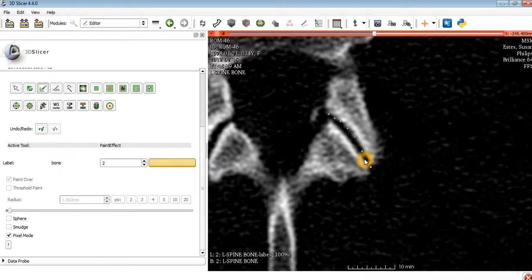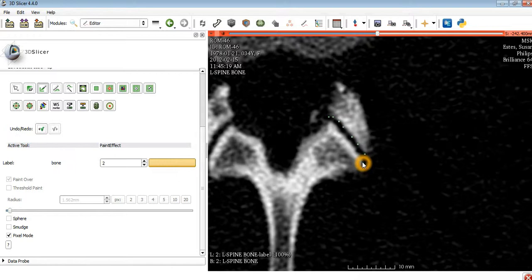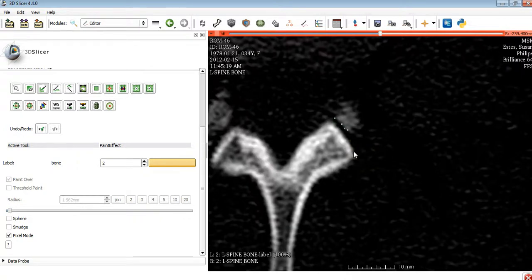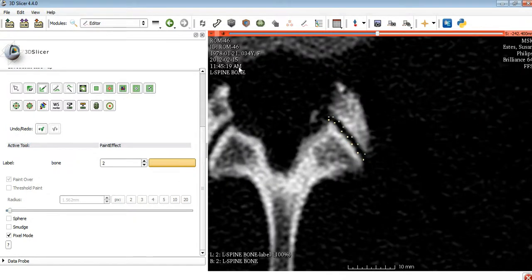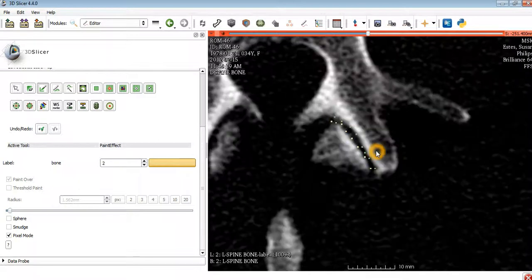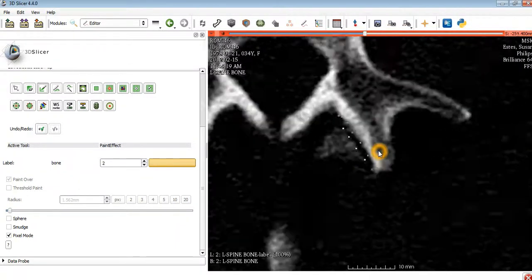The more, the better quality, if you will, of the surface. But if it's straight like these facet joints, it doesn't particularly matter as much. These gaps will be filled in appropriately. And the last one, and that should work. Okay, so we have points for each slice corresponding to each facet.